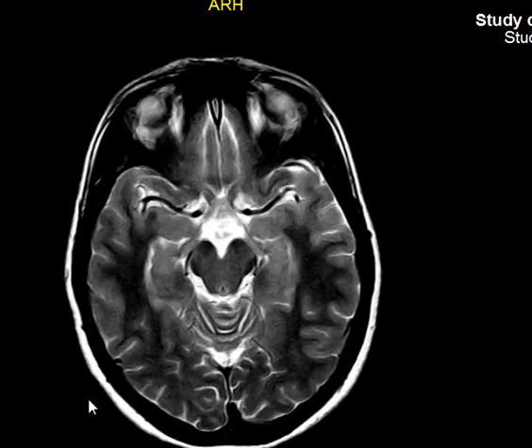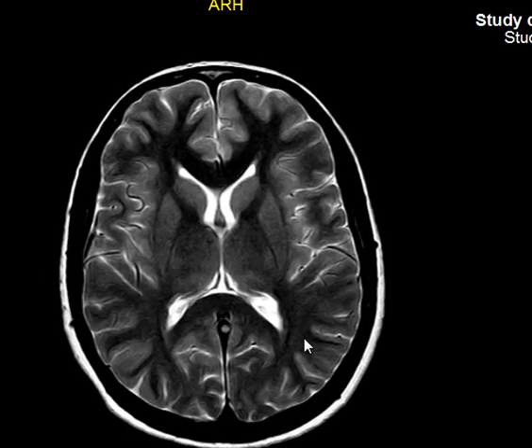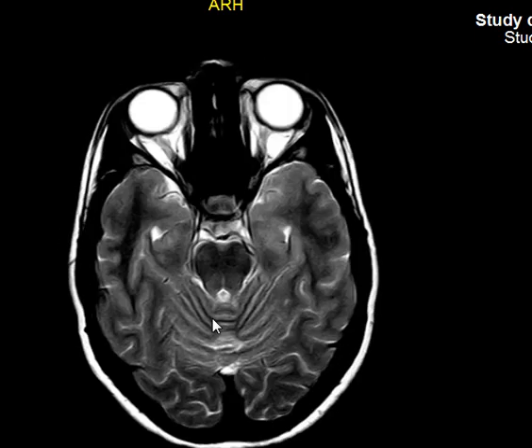We have here the temporal lobe, and we have the frontal lobe, and we have the parietal lobe. It's also a big part, but the frontal is bigger, okay? And you have the last thing here, this tiny small one, is the occipital lobe.